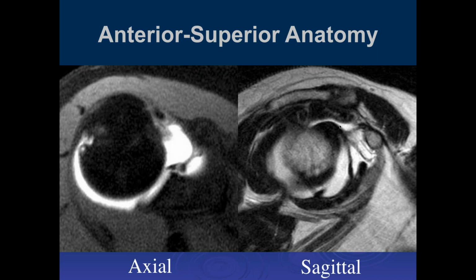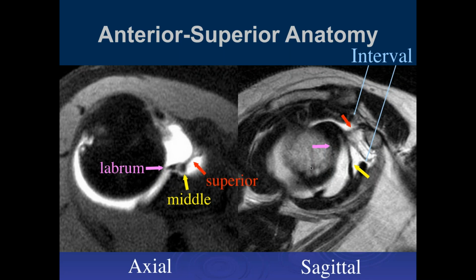And the sagittal plane here, we can see the superior glenohumeral ligament complex is up here. This is the middle glenohumeral ligament, which comes down and really attaches to the fibrous capsule of the subscapularis muscle here, and then to the glenoid, and then the anterior labrum there. So that's a labrum, the middle glenohumeral ligament, and this is the rotator cuff interval that you're all familiar with. And you have to have an interval here because you have to have space for the coracoid process here in anatomy.